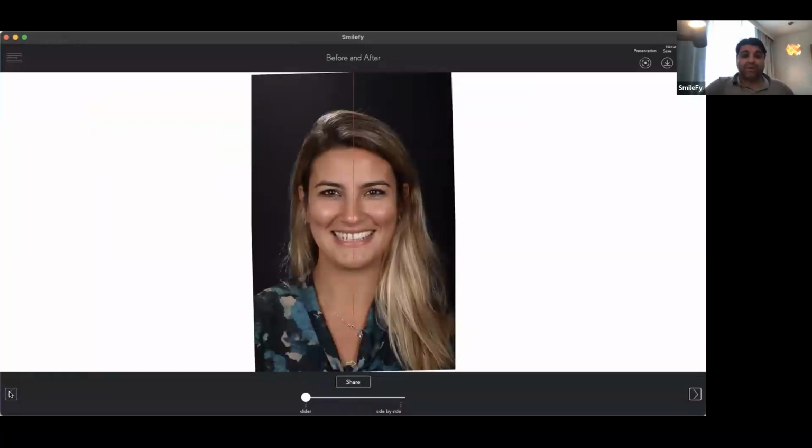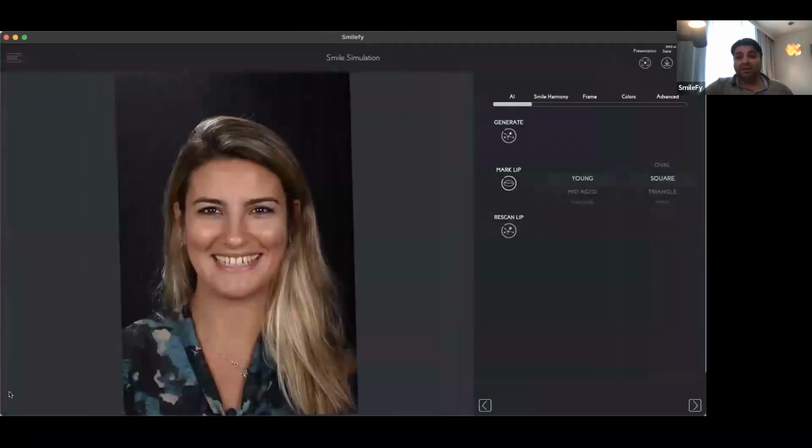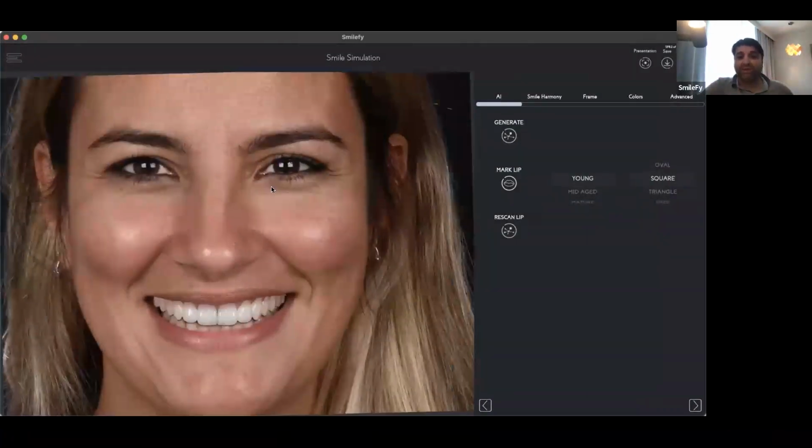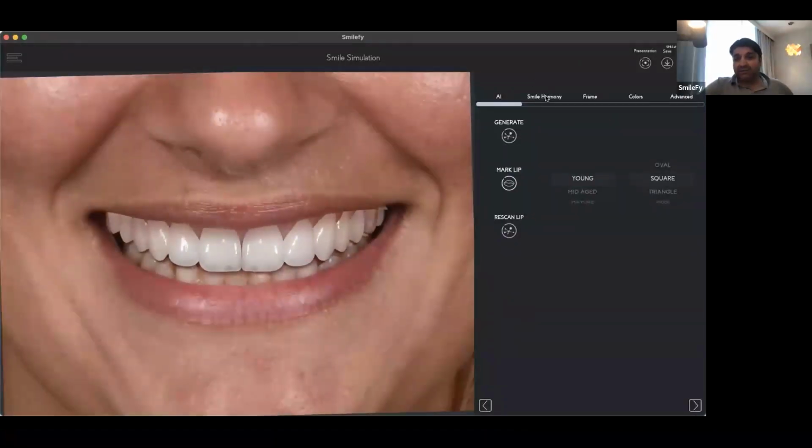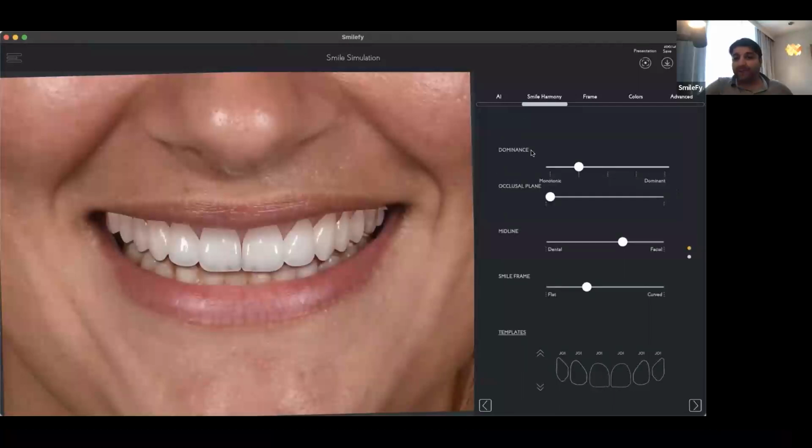So let's go a little bit back and discuss what we can get as information and patient preference when it comes to the smile design. In the section Smile Harmony, we have the slider dominance.